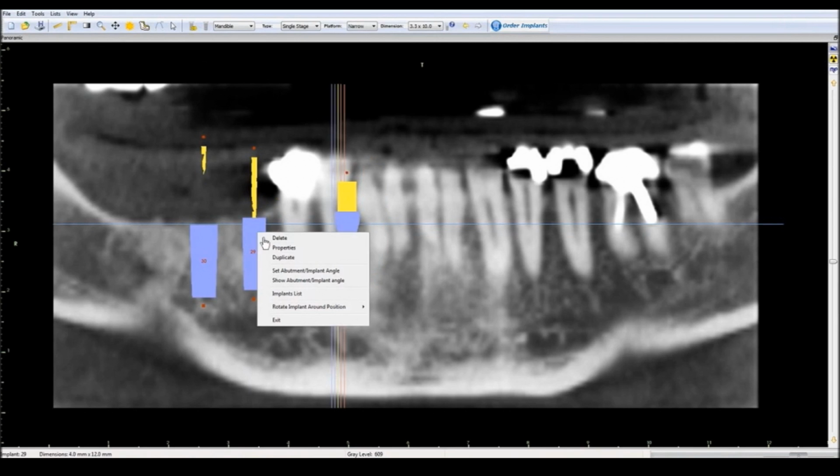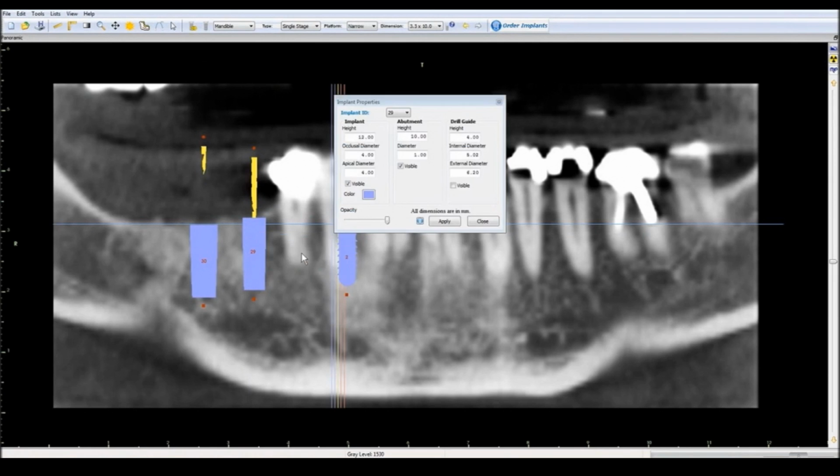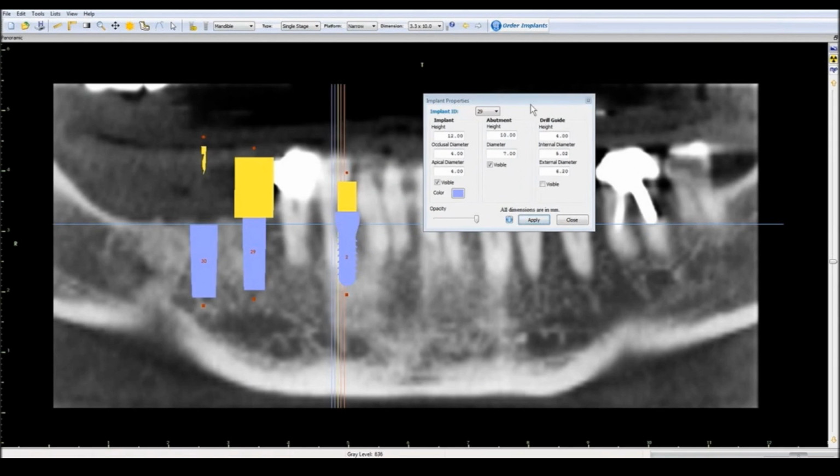The next thing I do is we use the abutments as future teeth. So it's restorative-driven, and in this case, it's been decided that this implant-supported bicuspid is going to be 7 millimeters mesial to distal. It could be 6, it could be 7.5.